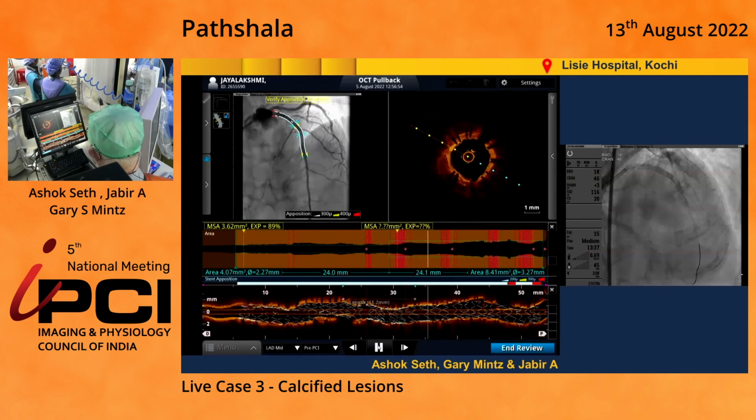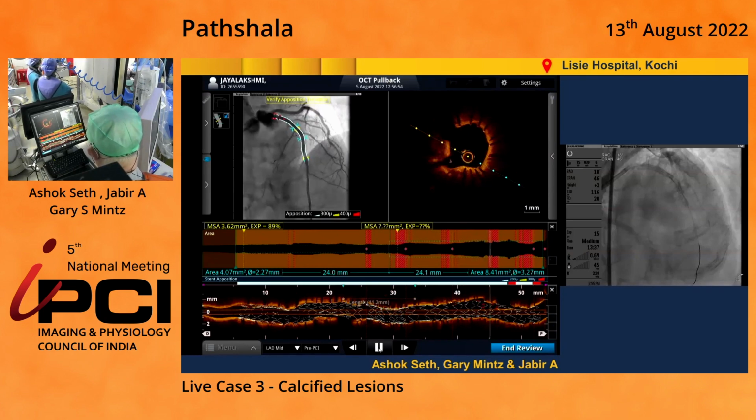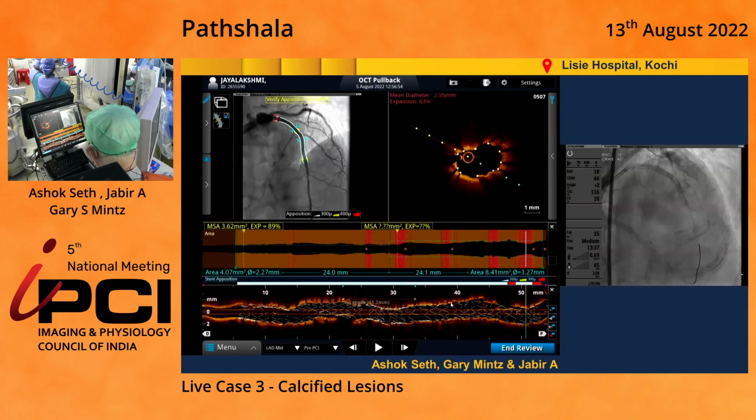And then the stent plumps up without any neointima. And then we'll take a look right at the index lesion from last June, which is here. At this point, the stent area is about 5 square millimeters. And this probably represented, again, a calcified nodule as the underlying mechanism of her STEMI.